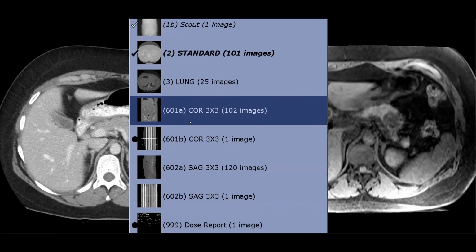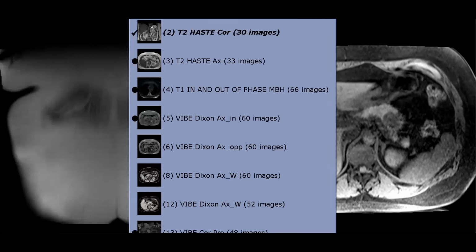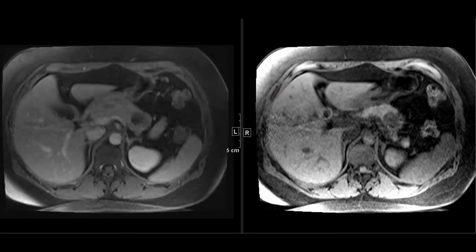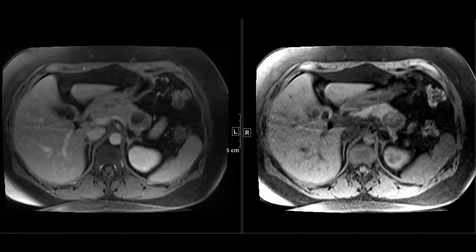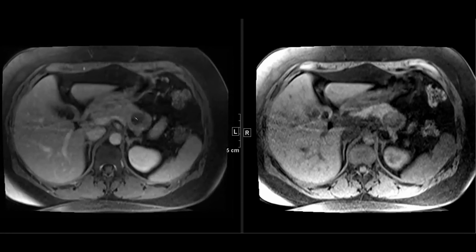And then when we go to the post-contrast, it's almost like a yin yang. So for example, this is the hemorrhagic part that's like non-enhancing, and then this is the pseudopapillary part that on the post-contrast is enhancing. So that's why it's called like solid and cystic, but it's actually basically solid and hemorrhagic. So any questions about SPEN?